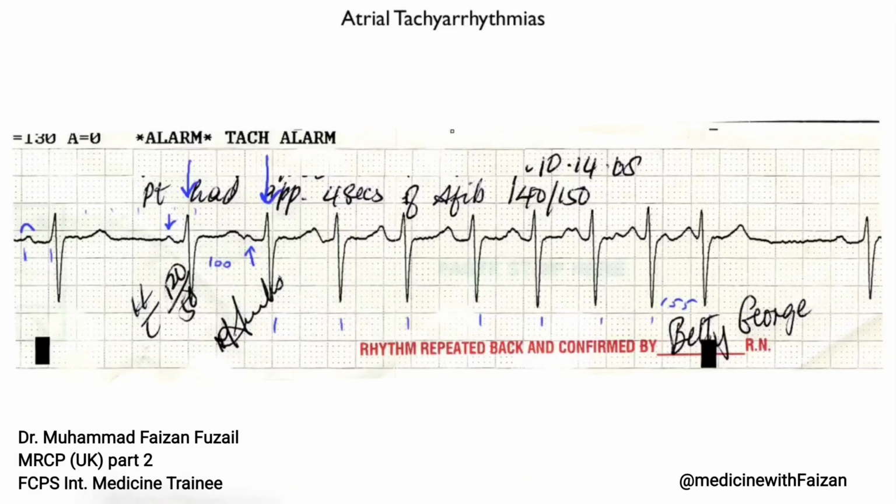So it's supraventricular, and you see this P wave that starts it off. So it's appropriate to call it atrial tachycardia, or AT for short. Now, one thing about atrial tachycardias is they can occur at rates anywhere from 100 up to 220 beats per minute. This one happens to have a particular pattern in that it warms up. A warm-up phenomenon means that the heart rate gradually increases as the arrhythmia progresses.